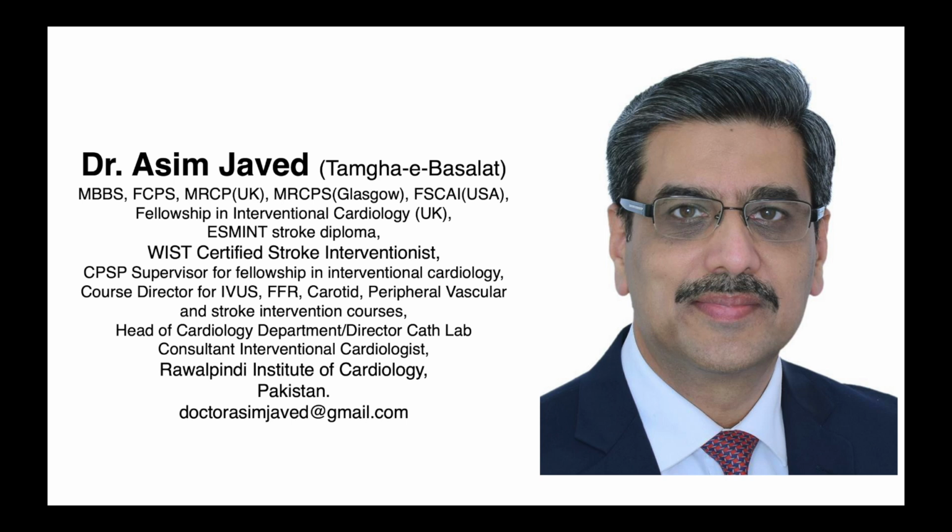I'm Dr. Asim Javed and I'm an interventional cardiologist working at Rawalpindi Institute of Cardiology in Pakistan. This is a series of talks to facilitate learning of image interpretation in coronary intravascular ultrasound.